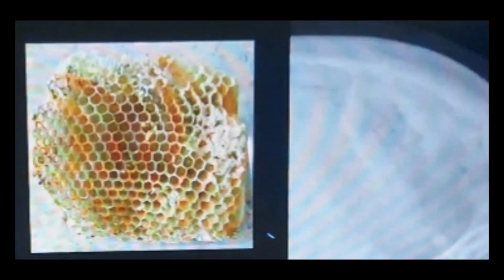Here is another example of the skull hemangioma. As I mentioned, the outer table would be involved, and the lytic lesion will look like honeycombing. So comparatively, the picture is given for the understanding. Another third important point is that the margins would be sclerotic.